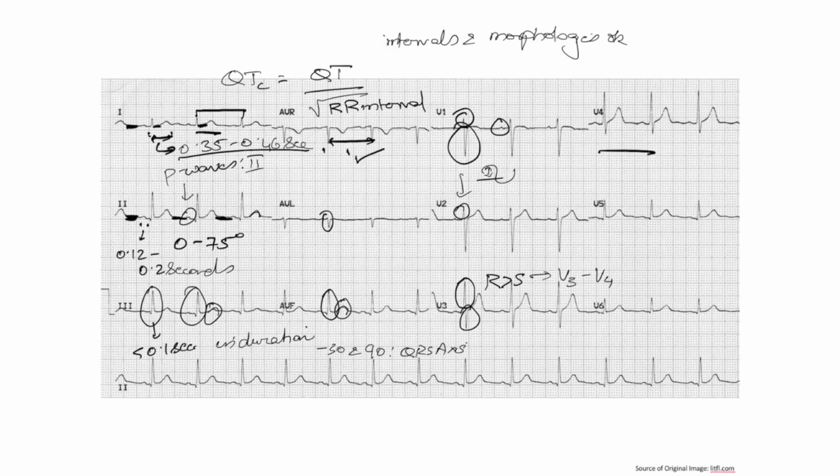At this point, understand that evaluating whether the QT interval is normal or not in a person with bradycardia or high heart rates can often be challenging. So, whenever you're evaluating an EKG, start by making sure the EKG is properly calibrated and you've verified the patient's information. Following this, evaluate the rate of the EKG, then the rhythm of the EKG, then the axis of the P and QRS complexes, and then look at the morphology of each wave as well as the duration and morphology of every segment and interval.